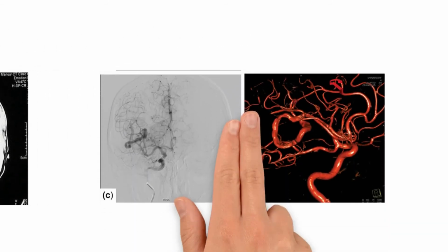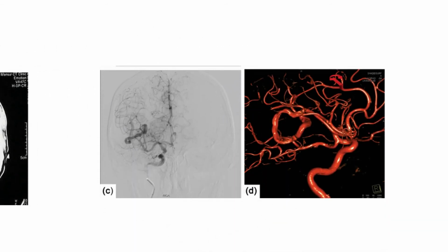Contrast material was used to identify the tumor cells more easily, as these cells picked up the contrast and the normal brain cells did not. An angiogram can be done with the CT scanner. The image can then be rendered in a 3D conformation for better visualization for the surgeon to plan the surgery.